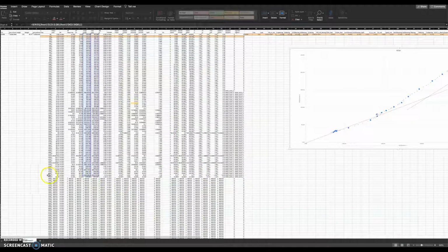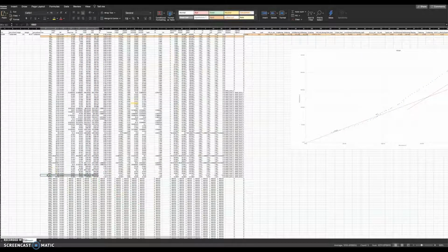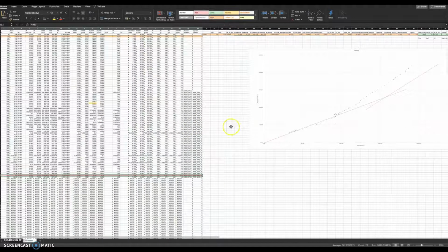So I'll mark this here as our max value, and the way I do that is just highlight across and click on red up here. Next thing we have to do is identify gas exchange threshold. VO2 and VCO2 are related up to a point. When you start exercising, at some point you start to produce more carbon dioxide than the increase in oxygen consumption. The production of CO2 is out of proportion to the consumption of oxygen. So you get this kick pattern, this V-slope pattern, and that's what we're interested in.